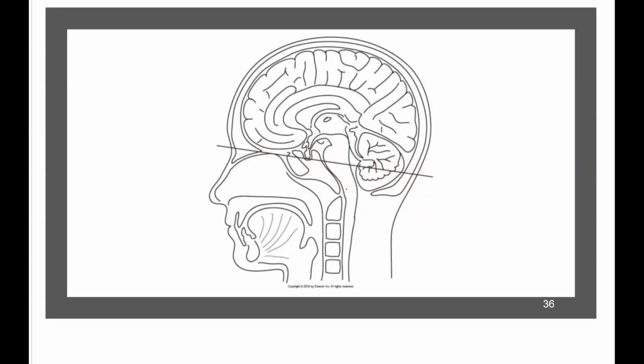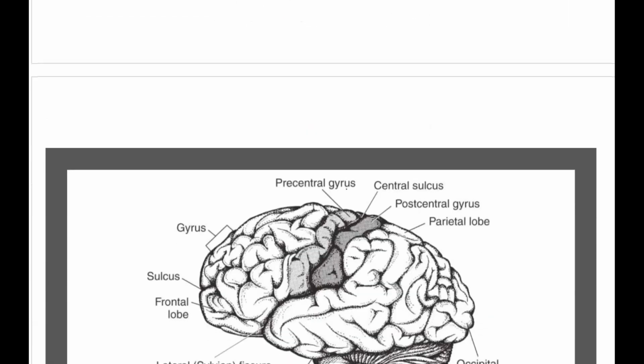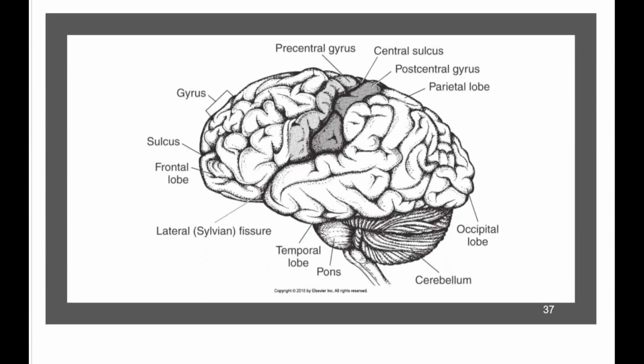All right. So if we're looking here, we're going even lower, so we should be well within the pituitary gland, if not all the way through it, and looking at the sphenoid sinus. So let's see. Oh, of course, we don't have an image. So looking here, we're going to start up here.